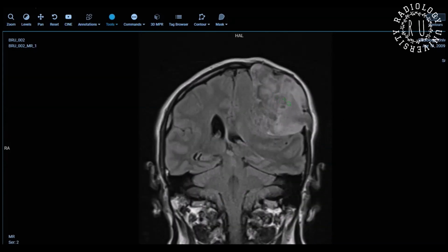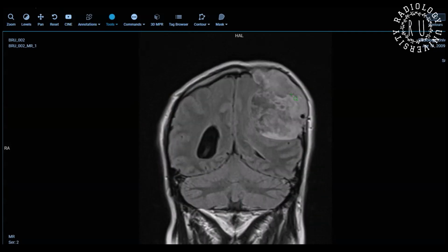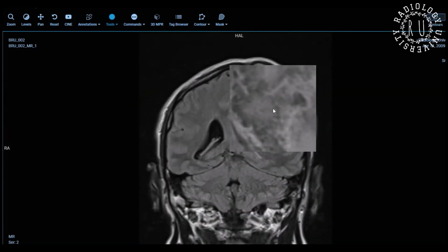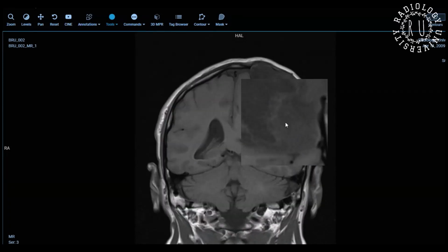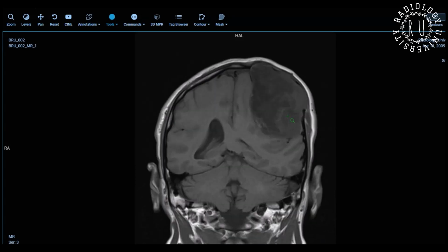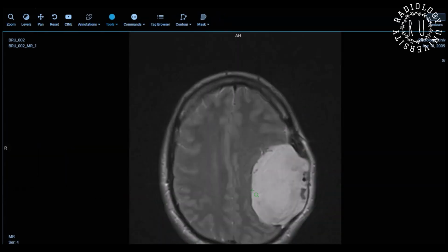This is an extraaxial lesion. Intensity wise, this is how you will say on FLAIR. FLAIR hyperintense. But what about these things with this central hypointensity? So you will call it heterogeneous, won't you? You won't label it directly. Why did you not ask me the T1, even though I showed you T1? What's the intensity on T1? It's again a bit heterogeneous, but mostly hypointense. Okay. How is it on T2? Hyperintense.